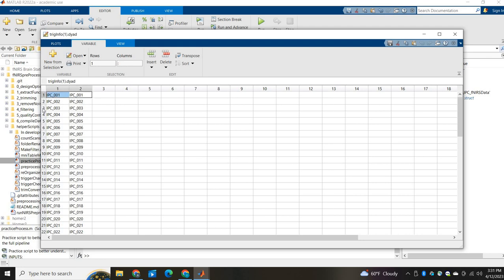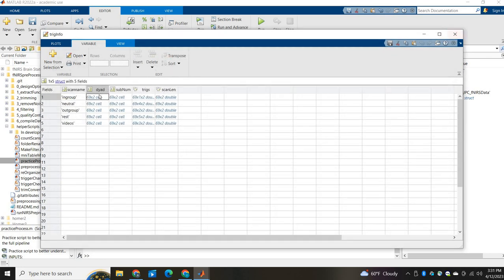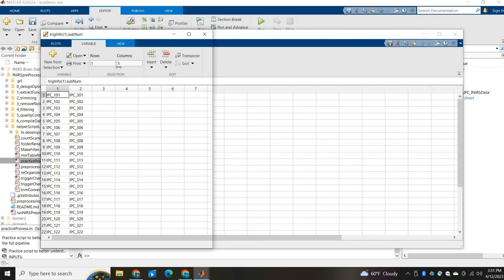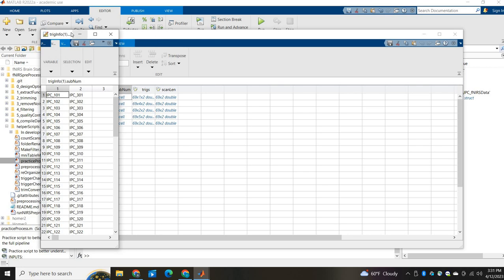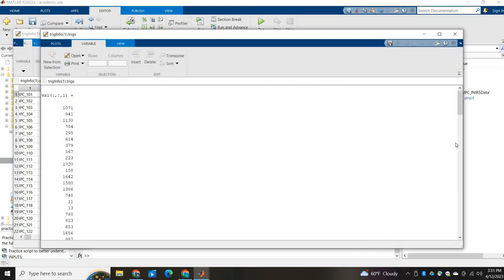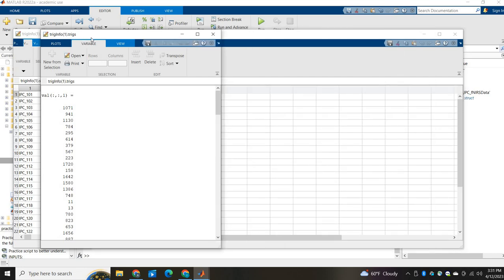So it's like, oh yeah, dyad 1, 2, 3, etc. It's also going to tell you the subject number. So here it's like IPC 101 and 301, so that's my subject 1 and 2. And the reason for this, and I'll show you, I'm just going to move this over here, is because you have all these triggers.